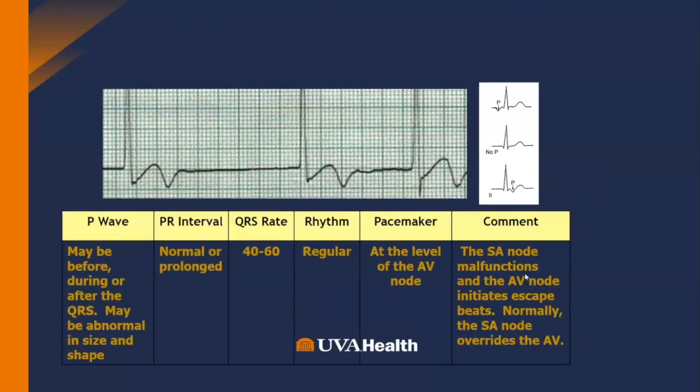Okay, so whoops. Let's take a look here. We got a little sidebar here that we haven't had before, so it's a little something to look at. So let's just take a look at this rhythm. What do we see distinctly here?